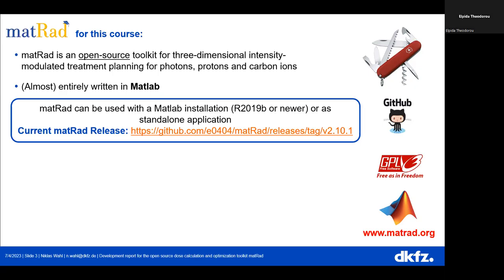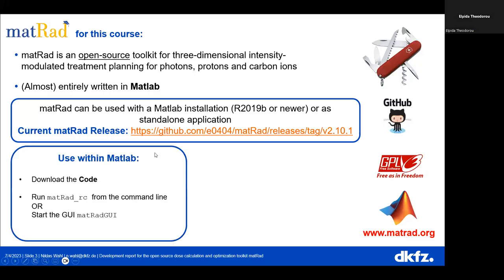And this link, which you can find in the PDF, points you directly at the release which we are going to use. So we use exactly this release. I will come back to that later and show you exactly how this website should look. But if you have the PDF from Indico, you should already be able to find this link and click it. But do not download anything just yet. Wait for further instructions.